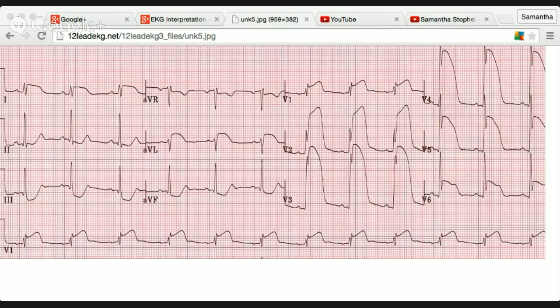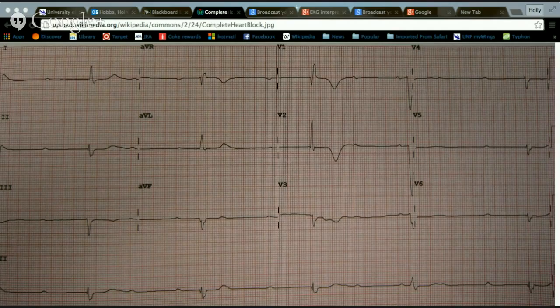Holly, it's your turn. Hi. Let me switch my, okay, here's my EKG.